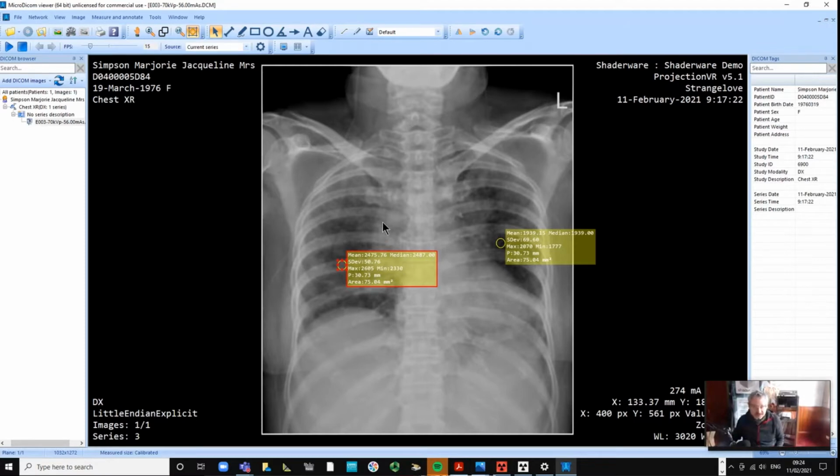Now, because of reproducibility, we need to say where we put it. So we put it on the right hand 1, 2, 3, 4, 5, 6, 7, 7th. And which bit is that? Is that the posterior or the anterior part of the rib? The posterior? Yeah. So we've put the region of interest on the right 7th posterior rib, in the mid-clavicular line, shall we say?